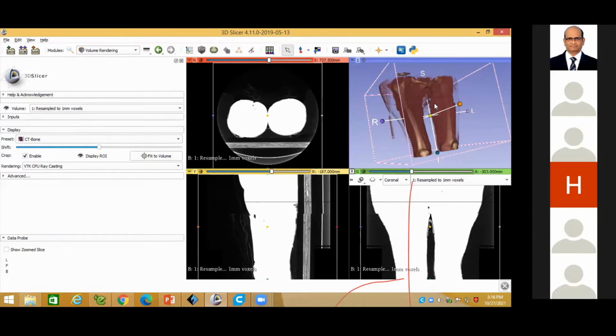With thresholding, we are going to assign density values, what we call density in our mechanical terminology. Here they use thresholding. Based on the threshold value, they extract their own region of interest, their individual parts. So I'm going to apply various threshold values with this shift here.